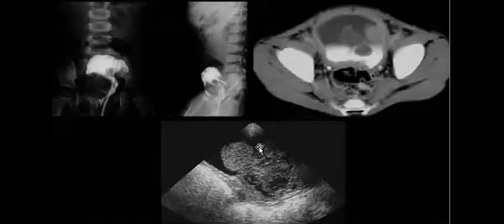Pediatric bladder mass. It can be sarcoma. It can also be what? If I show this one on ultrasound, it can be sarcoma as a tumor. If it's not a tumor, it will be what?